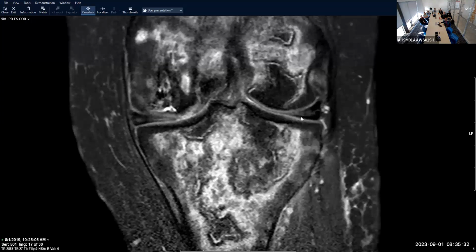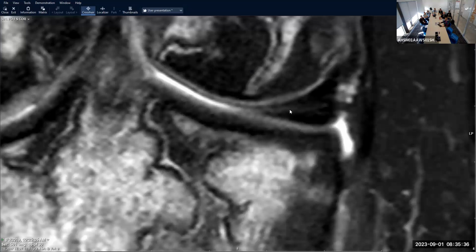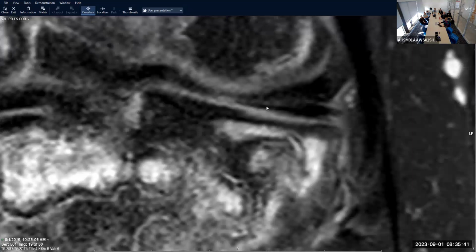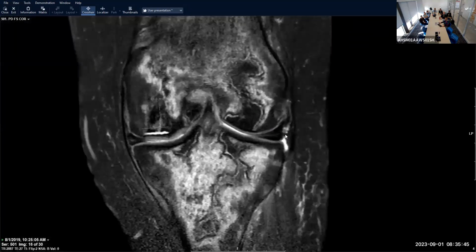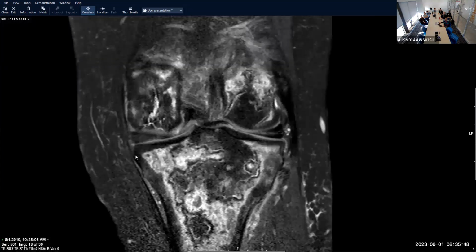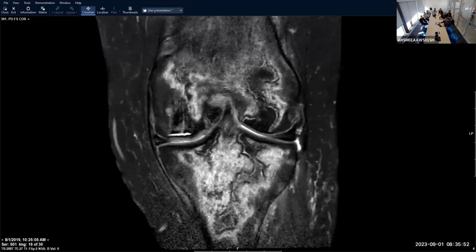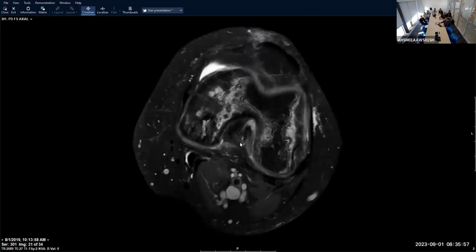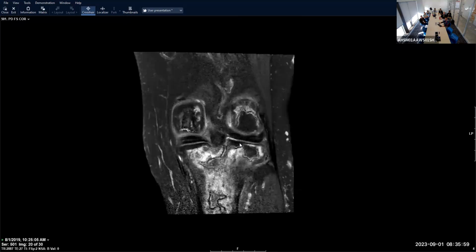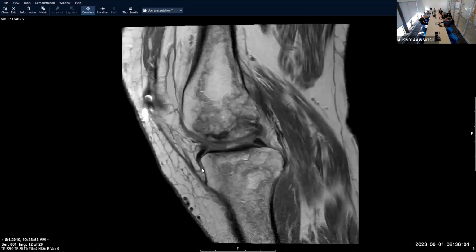Here, this meniscus is probably also torn. It looks like we have a 2-slice touch rule. The signal is disrupting this meniscal surface on 2 consecutive slices. It's going into this posterior horn area too. So this would be a horizontal tear of the lateral meniscus. Similar appearing medial meniscus. So either really, really prominent vascularity or they've got bilateral horizontal tears. So yeah, the crux of this one was AVN and OCD and just instability criteria.